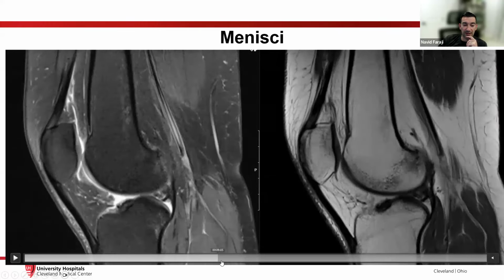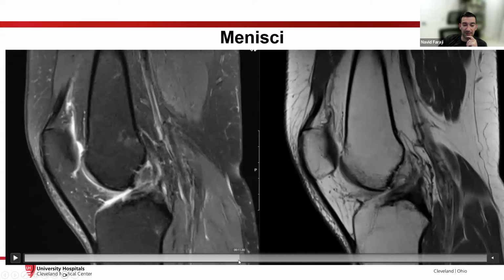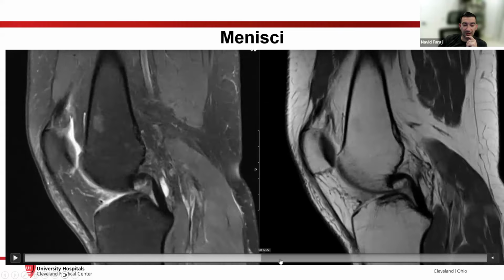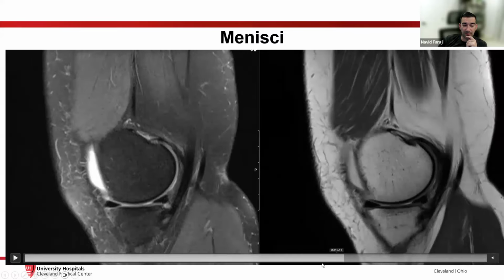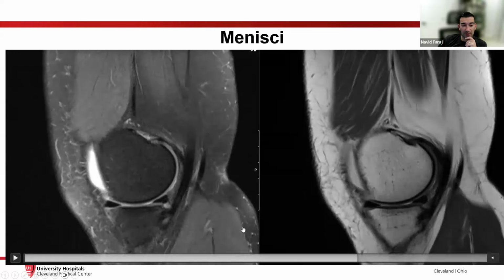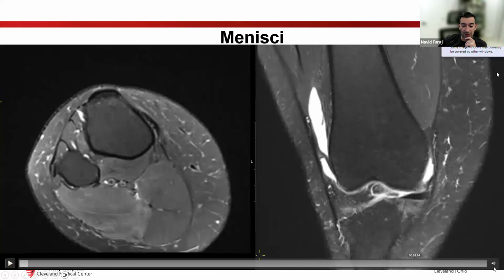The ACL is also out in this person just to show an example of what's probably a chronic, maybe a long-standing ACL tear, because I didn't see a pivot shift, but there's no ACL here. There should be an ACL there, and there's that PCL by comparison. We can see some bone marrow edema of the tibia, telling us that there's some osseous contusions as well. So I want to show you that on another plane, just so you can see on two other planes.